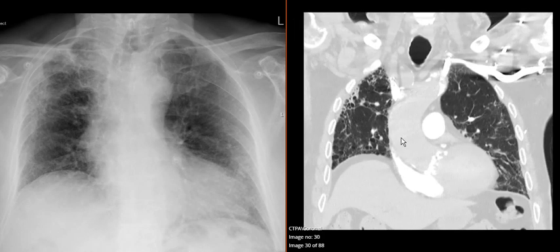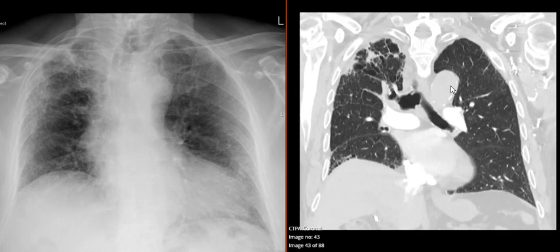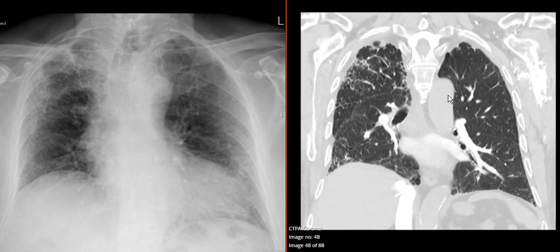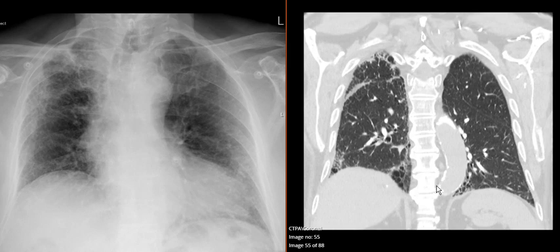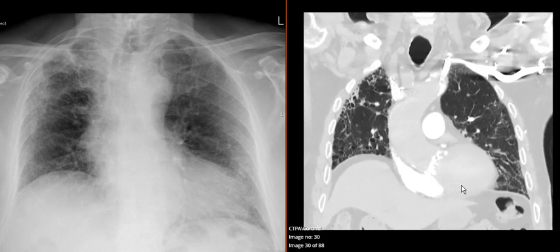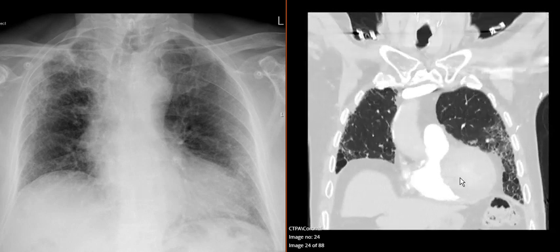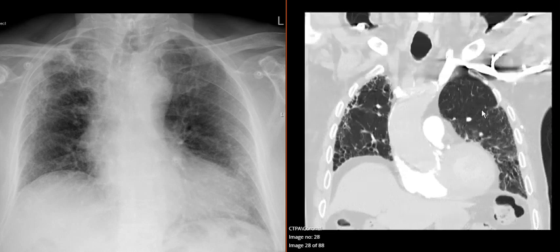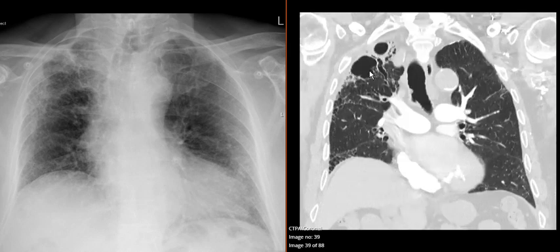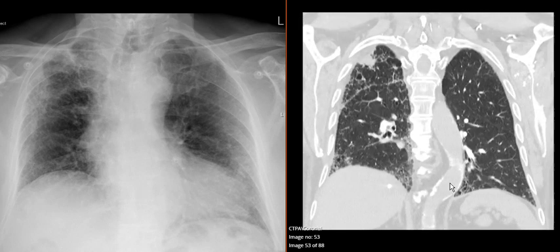That's the left ventricle. The aorta looks maybe mildly dilated, but nothing drastic. And then coming down, so smoking history and lung destruction in emphysema, but also hardening of the arteries, which is another hallmark of vascular disease and coronary artery disease. Can we see an obvious coronary artery coming down here? Not with the contrast. So yeah, walls and voids of emphysema, structural fibrotic changes and big holes from tuberculosis, and calcified and hardened arteries from vascular disease from the smoking history.